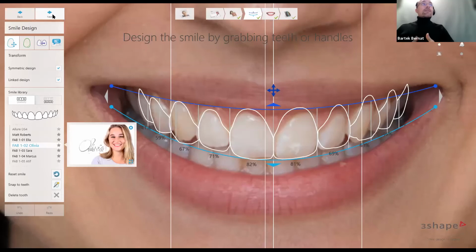So now the first step is just to do some contouring. You can do contours first, and again, I've done this a bit for you. So you can obviously manipulate the sizes here everywhere. Also, for an individual tooth, you can make it symmetrical or not.